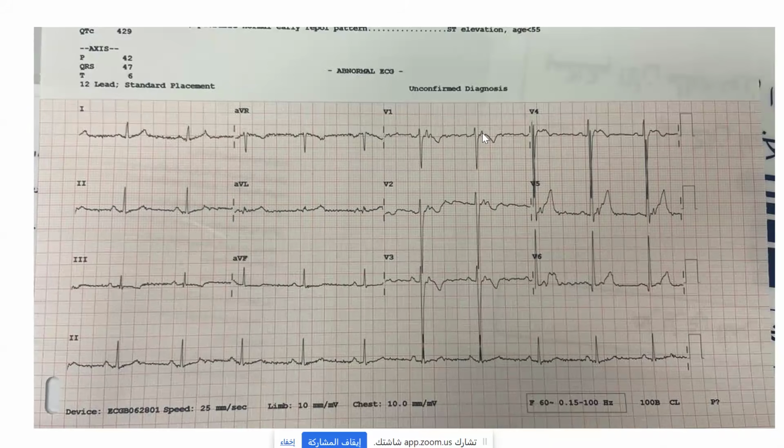Namarek, are you a cardiologist? No, I'm an internal medicine doctor. Internal medicine, good. It's tough. I mean, is there any cardiologist here? Could be sodium channelopathy, like Brugada. But it is not like Brugada. It's a curved T wave. I will show you some Brugada patterns, but here it is not. Look at the end, the fractionation. What could be the cause of this?